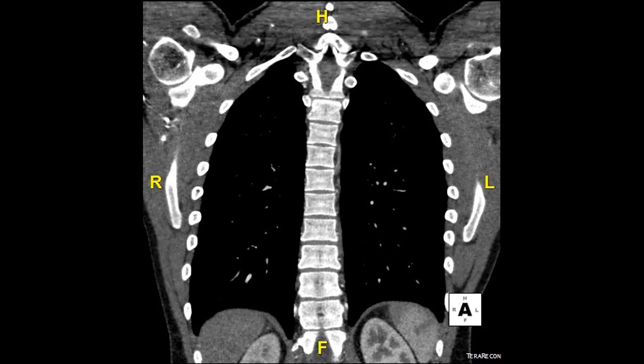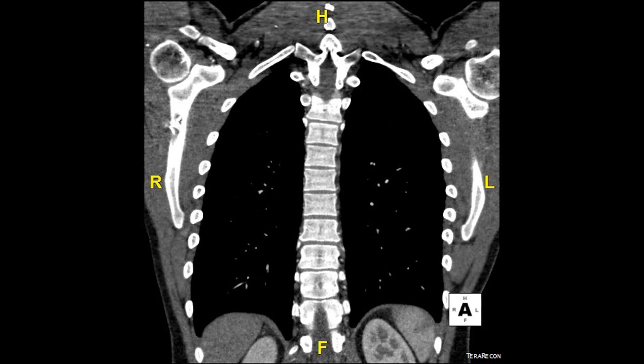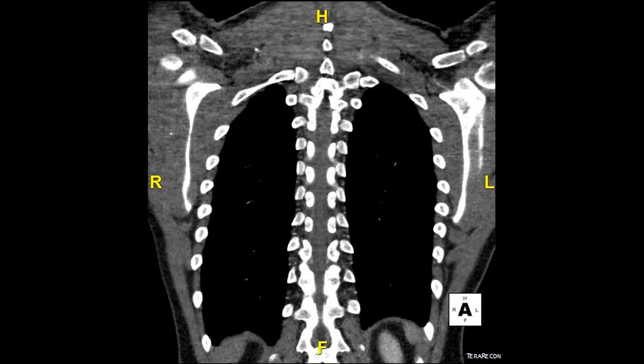We've now passed by all of the major structures of the thorax and mediastinum and have a great view of the thoracic vertebrae. The last thing I will be pointing out in this image set is the vertebral canal, which we'll see in a few more slides. I'll be scrolling relatively quickly now since there isn't much more to see here. Here is a great view of the vertebral canal and the spinal cord, and I'll outline the spinal cord quickly in blue.